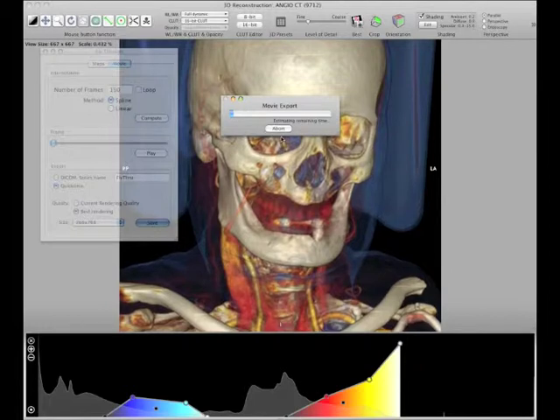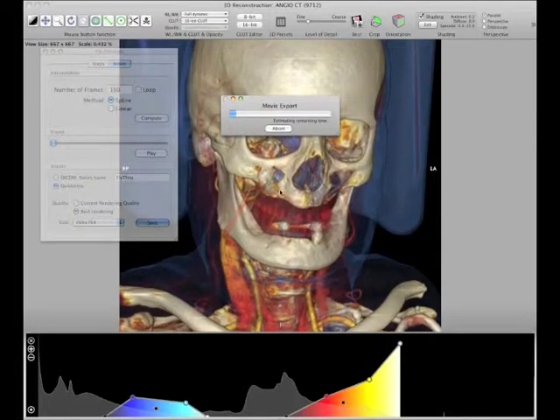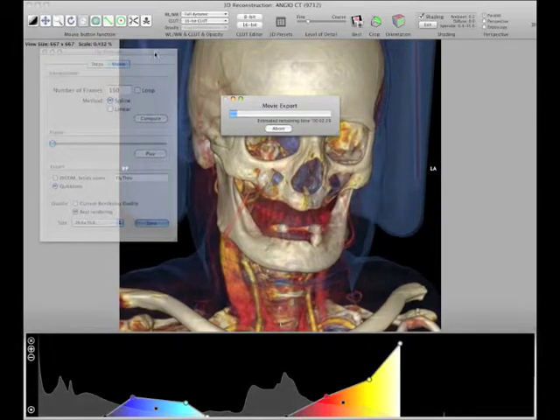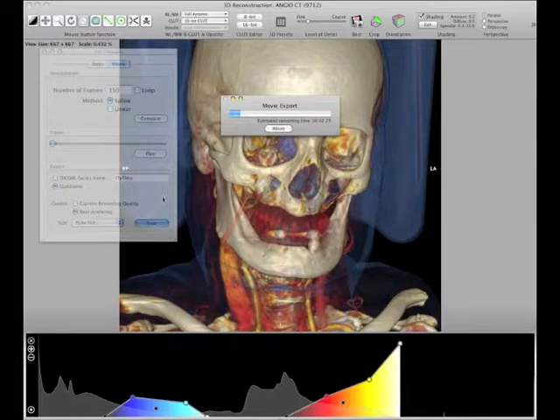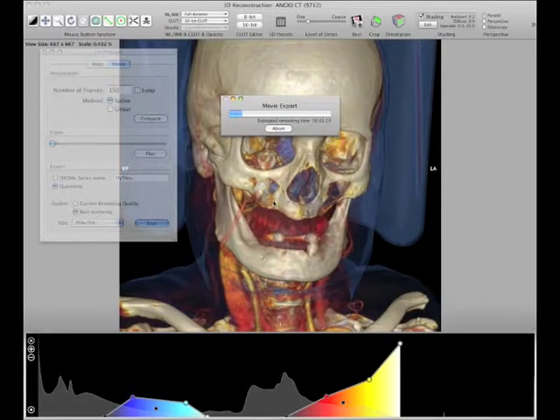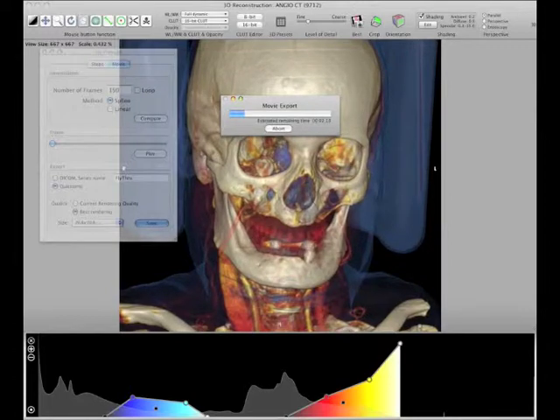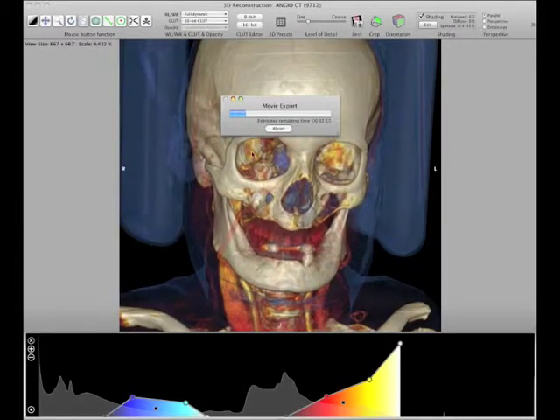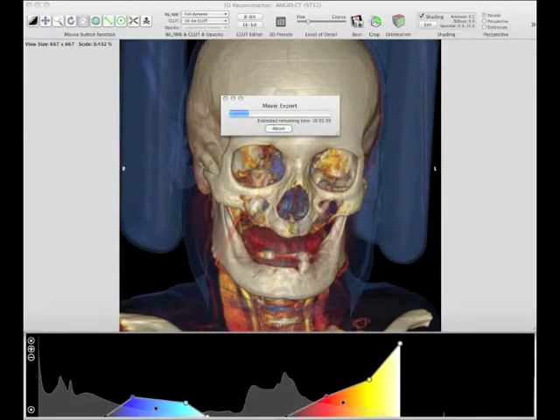You need to remember what that name is. What it's doing is it's basically creating frames from the keyframes that you set for your movie. And it will create them into a QuickTime movie, which you can export. And I'll show you about saving the movie in the next step. That way we don't have to sit here and wait for this thing to render. Okay? Thanks.